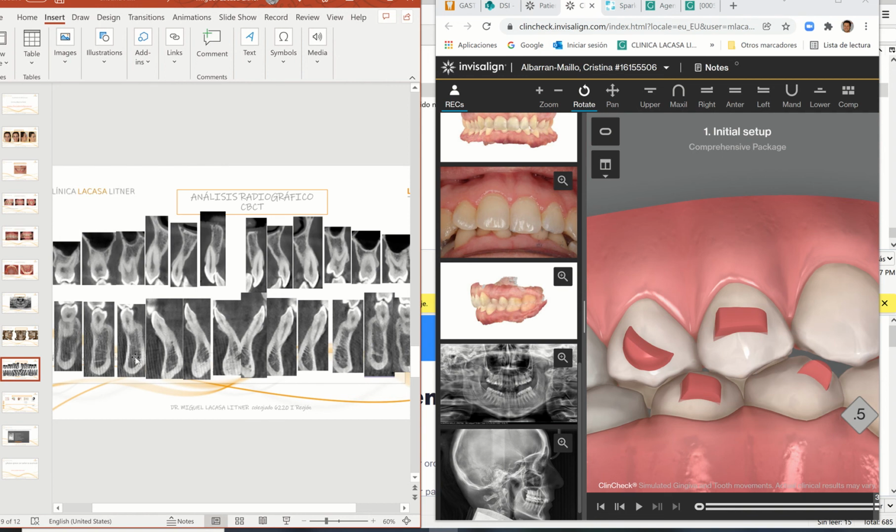If you take a close look at this that I'm pointing at, there's no buccal bone. In fact, as I see in 90% of the CBCTs in my adult patients, those premolars are partially out of bone before starting orthodontic treatment, okay? So you better not expand this.